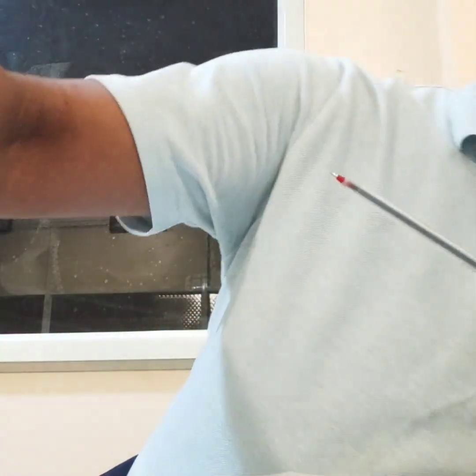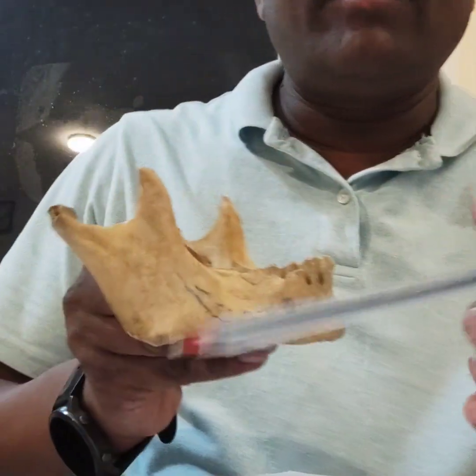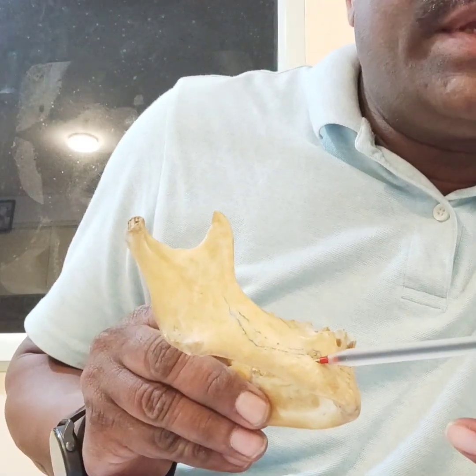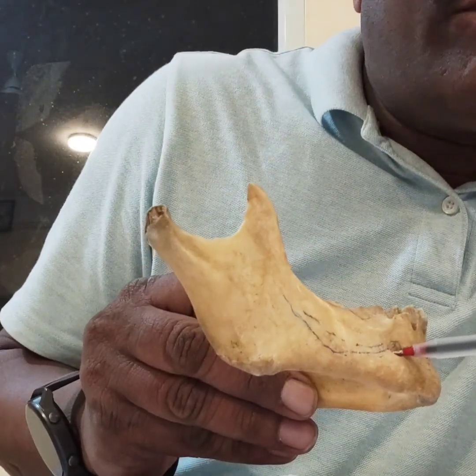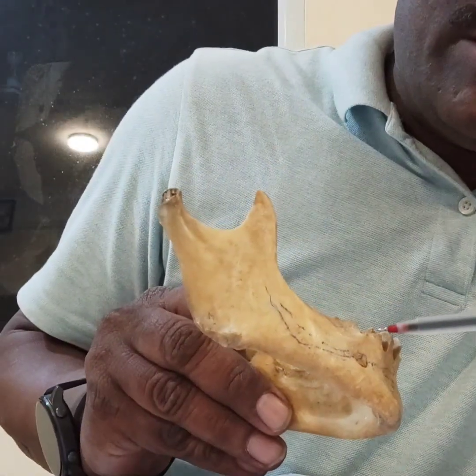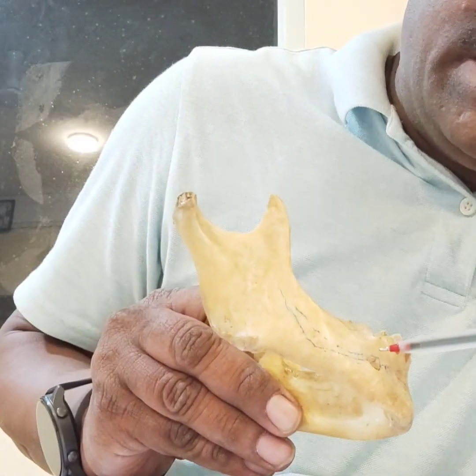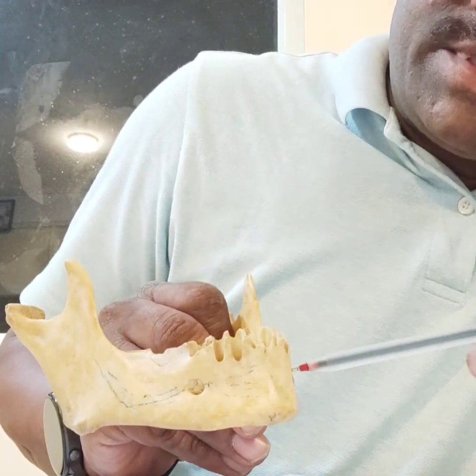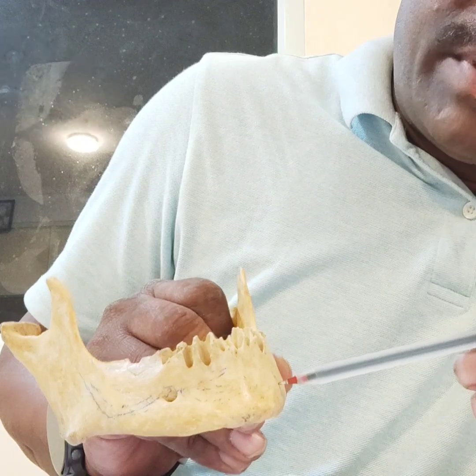When we come to the mandible, I'll give a brief explanation about the mandible also. You can have a look at this, this is the mental foramen. You can have a look. It lies just below the second premolar or a little mesial to the second premolar. Here on both the sides it will be the same. This area you have to be careful while placing the implant.